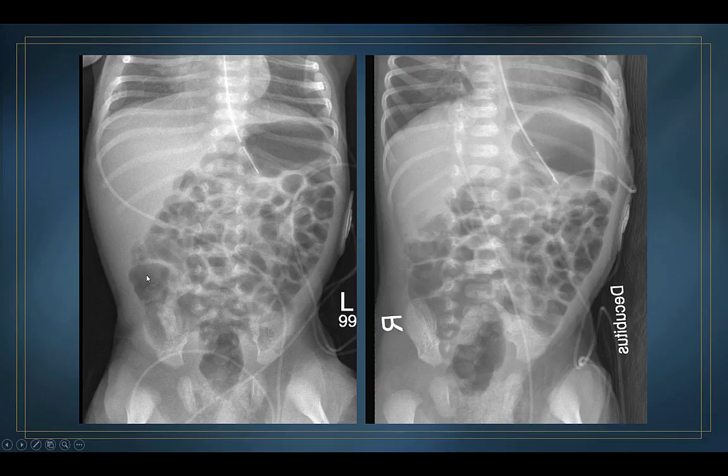Okay, I just wanted to say a few words briefly about properitoneal fat. It's not something that should confuse us, but sometimes it's sort of a confusing finding to our clinical colleagues. This is properitoneal fat right here, okay? And the reason why on the supine film you may not see much, whereas on the decube you see it more dramatically, is that in the supine position I consider the fact that the liver is compressing that fat.